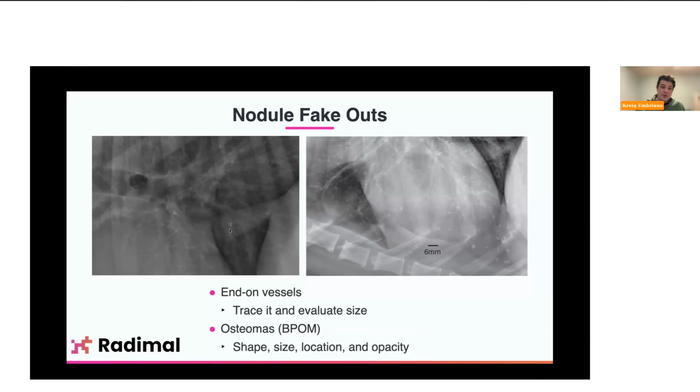I mean, these are in the 2 to 3 millimeter range in diameter. And then if we look over here on this side, we've got an older dog with these little mineralizations. They're a little bit more irregular in shape. They still have a sharp margin. They're very opaque. They're very conspicuous to your eye. And so these are going to be osteomas.